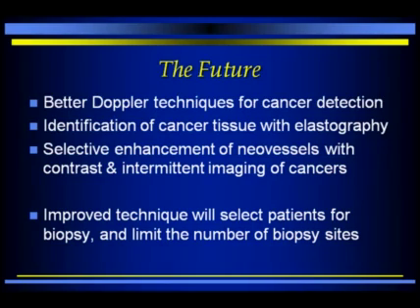So I'm trying to give you a very rapid fly-through of prostate imaging here with some of the newer techniques that are used for prostate imaging. In summary, prostate imaging is done for a couple of benign reasons: infertility, inflammatory processes. When you're looking at infertility, you're trying to see, is there an obstruction of the ejaculatory ducts? Is there an absent vas deferens or a seminal vesicle? When you're looking for inflammatory lesions, you want to make sure there's no abscess sitting in the prostate. And then when you're looking for tumor, you're trying to basically direct your biopsies into the area that's going to maximize the positive biopsy yield.